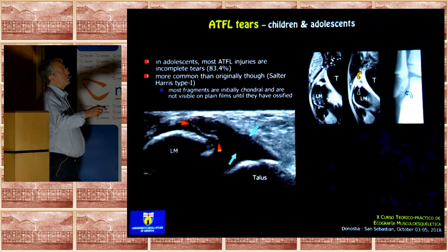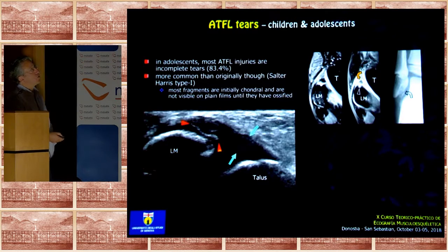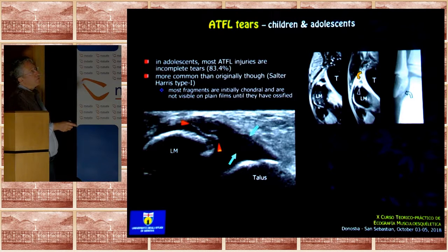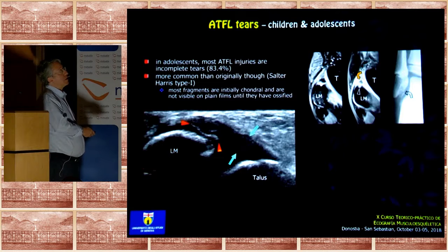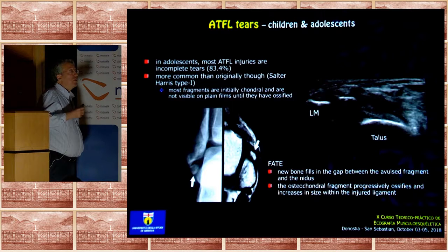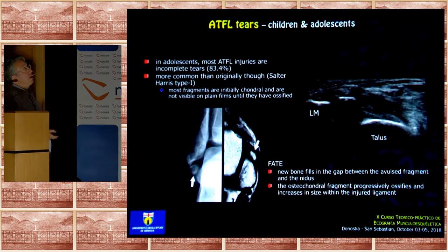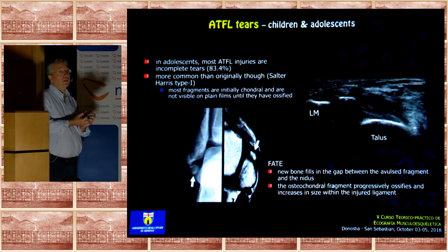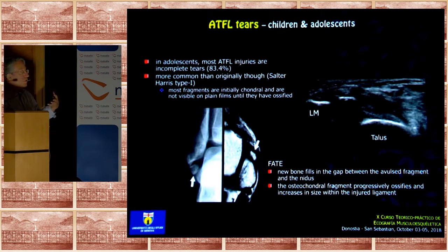In some instances, you can have a double cortical line related to the avulsion of the most superficial layer of the cortex. In general, this occurs at the level of the lateral malleolus and not at the level of the distal insertion, because this is the most biomechanically exposed area. Remember that in many cases, especially if the trauma occurred earlier, you can also have the avulsion and the fragmentation of the cartilage when the lateral malleolus is not really ossified but is still chondral.